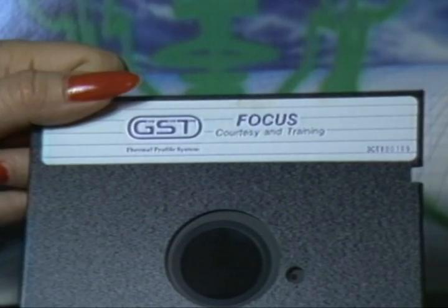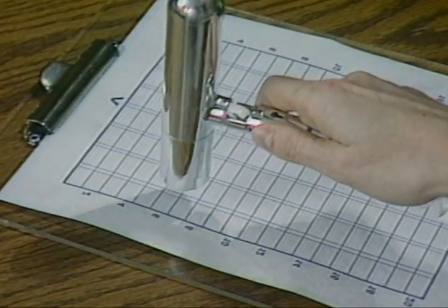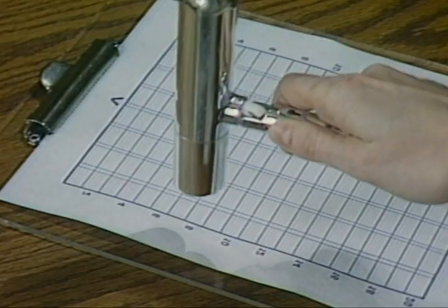The GST Focus operating system includes the Courtesy and Training Programs disk. This disk helps a new user become familiar with the techniques central to using the GST Thermal Profile system. For the infrequent user, this training system can renew skills and reaffirm the proper scanning techniques.